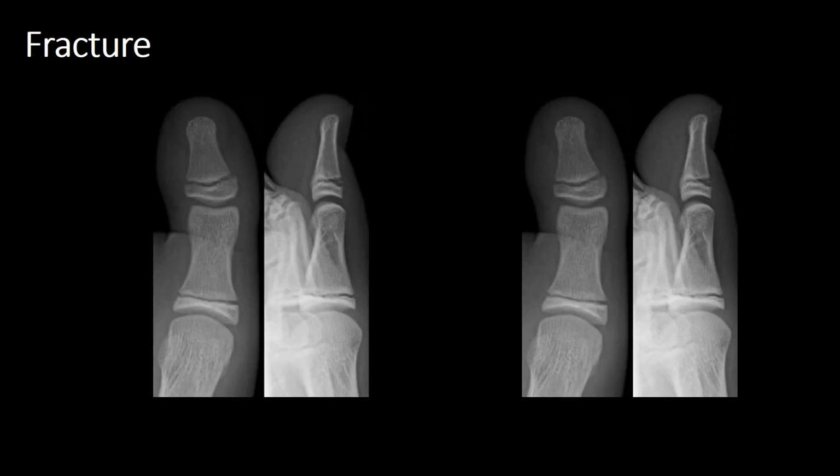Toe injuries are frequently common and they occur in both adults and paediatrics. And here we have a paediatric great toe. And we can see there is a tiny osseous fragment that is adjacent to the physis. And so therefore this tiny osseous fragment comes from the adjacent metaphysis. So this is in fact a Salter-Harris injury. Even though that osseous fragment is very small, it's still a Salter-Harris injury.